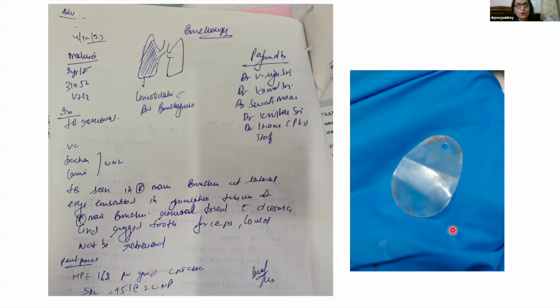It had been missed on two bronchoscopies before, because probably 3 months had passed between the aspiration and the first bronchoscopy. It had got embedded in the wall, and it had been missed. They saw something white and thought it was granulation tissue. They started ATT, and what it was was this foreign body.